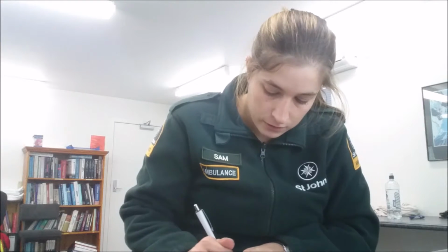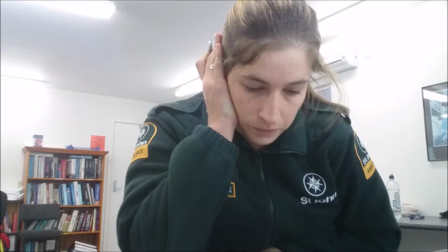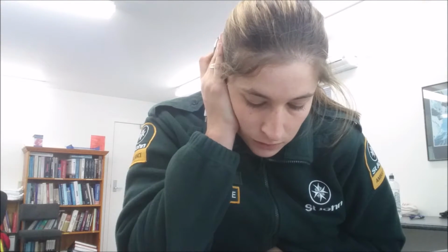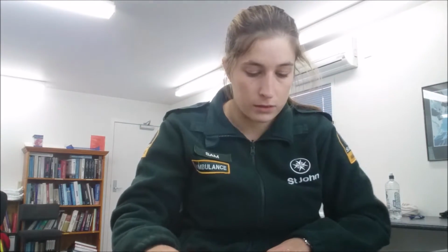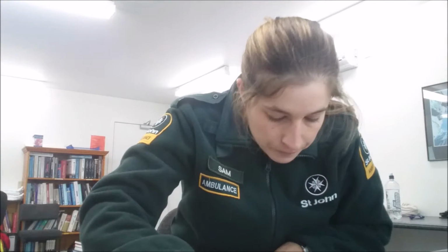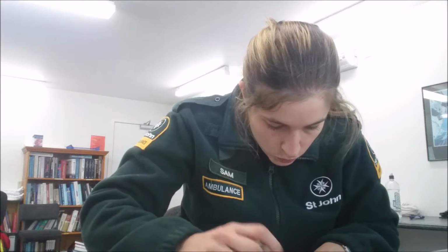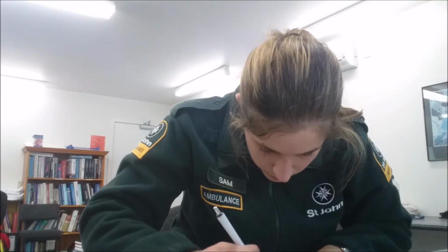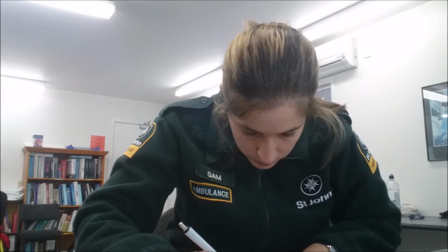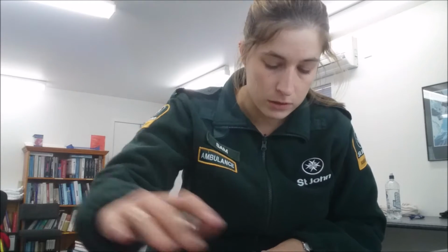How old was the patient again? Sorry, 60-year-old female. Cool. Now I'll work out if it's regular by marking P waves. So it is regular, so I can use the 1500 method for this one.